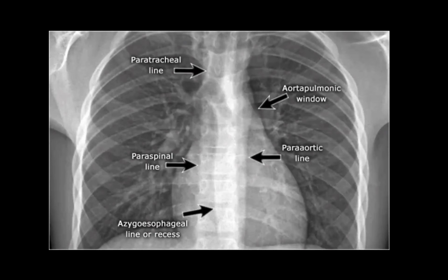and dissections and all of that. Mediastinal hematoma. So it's a really important structure to look for.